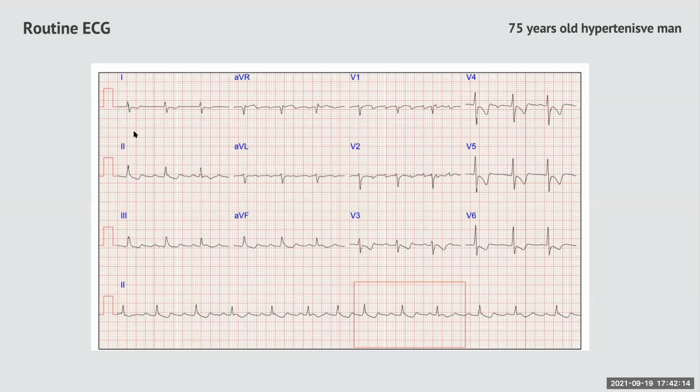So basically, looking at lead 1 and AVF, if you can give them the thumbs up sign, then you'll say, okay, fine, this is normal axis. But as soon as one of the leads is negative, then you have to think about axis deviation. And for simplicity's sake, I remember only one: if lead 1 is negative, it is almost always right axis, and it can be extreme right axis. But if the other lead is negative and lead 1 is positive, then it's left axis deviation. Okay, so we looked at this.